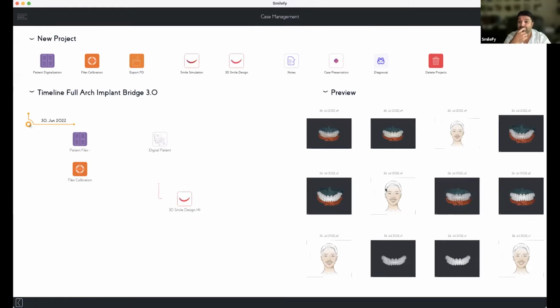So the landmarks that you could put on the intraoral scan and on the facial scan were super accurate. And then if we have the DICOM file, the segmented STL file from the DICOM file, calibrated with the intraoral scan, calibrated with the facial scan, and the implant position, then we can have a beautiful digital patient with the full treatment in this digital head. And with the opacity sliders, you can see all the layers and all the positions of the implants, of the design and everything.